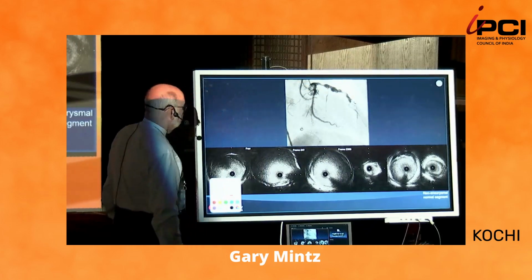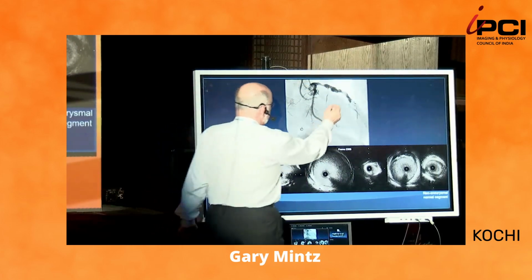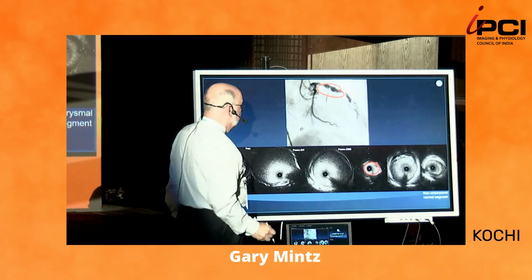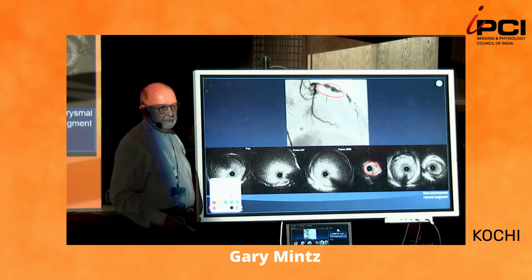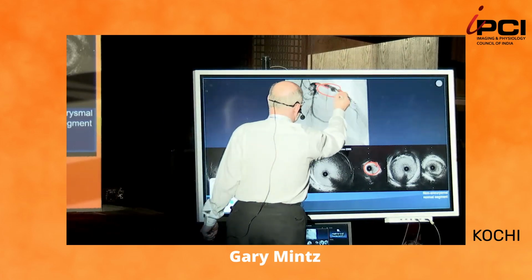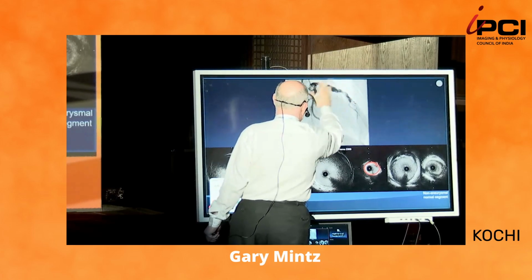Another example of a true aneurysm. When you see these true aneurysms, you'll often have tight stenoses on both sides, and they're often calcified. So it makes it hard to treat, but there's nothing wrong with stenting across this. You know? So I'm not doing very good.